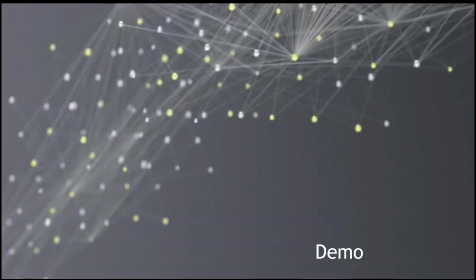I don't know if you have questions, but I'm going to show you very quickly how MONAI Label works. I mean, not everything, but at least a piece of that. But if you have any questions or comments, yes, please. Maybe I can direct the demo to answer some questions that I have as a new user to MONAI Label.